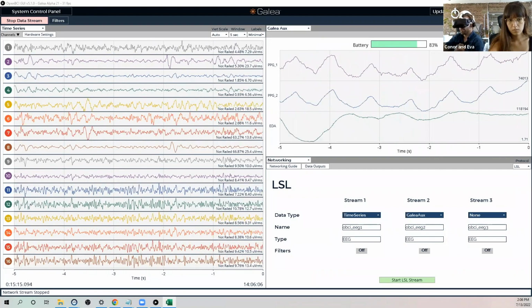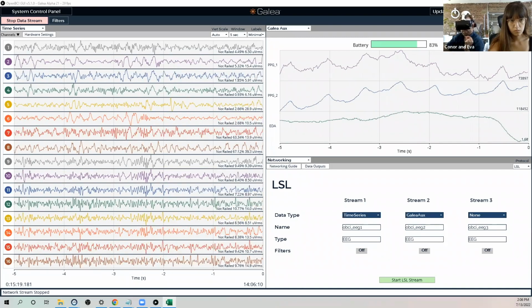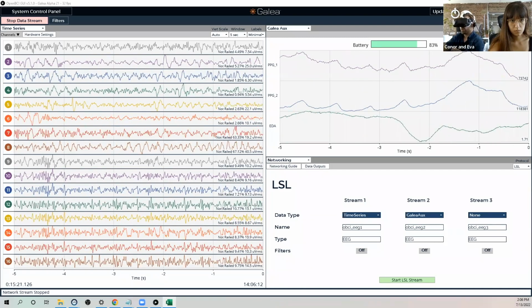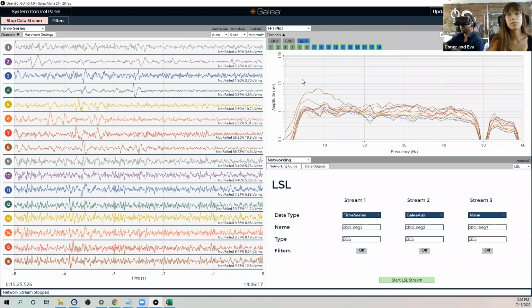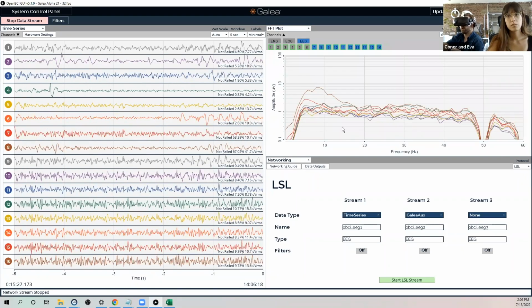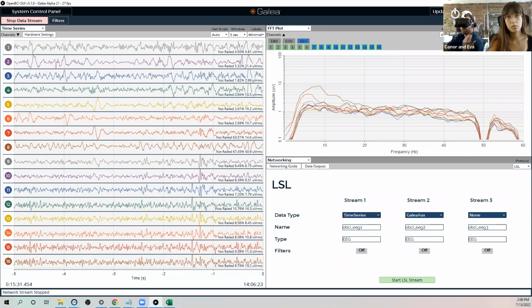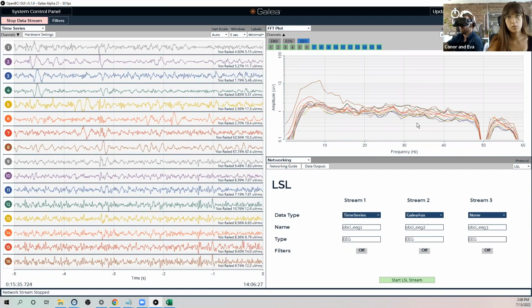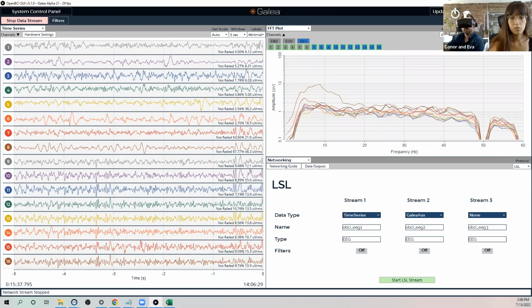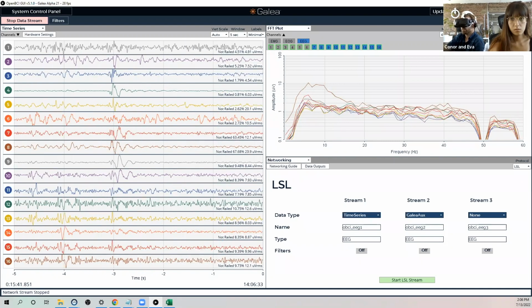But I think, as you can see here, even with the alpha devices and while the VR headset is connected to main, we're getting really, really clean data. And just looking at the noise floor, right? The Galea device is mounted onto the VR headset, which is connected to a computer, which is connected to main. And we're still seeing very clean electrical data, even though the system is dry. So we're really pleased with the signal quality.